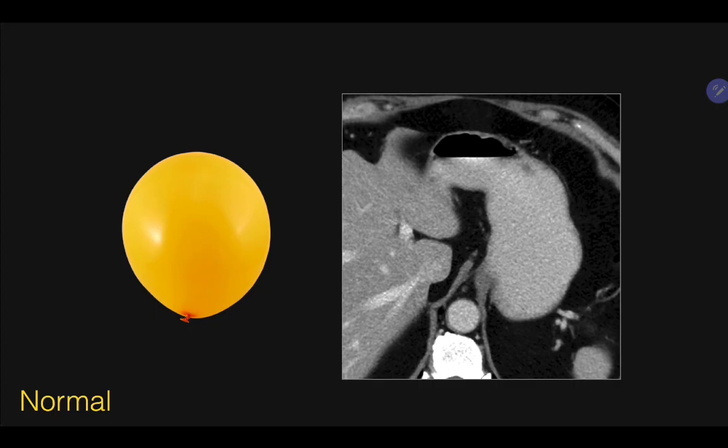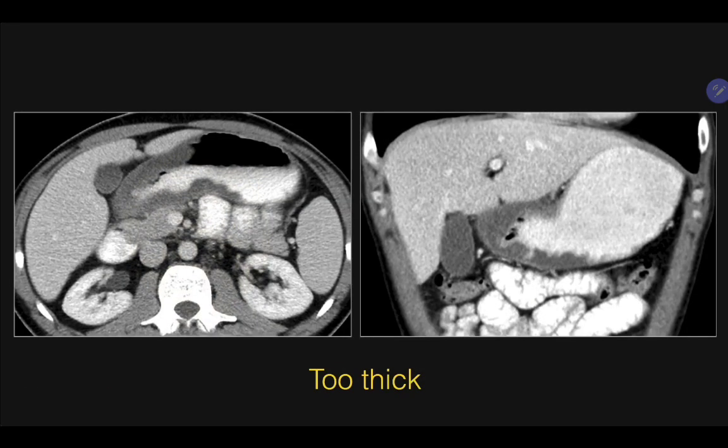Of course, the real diagnostic challenge comes in when the wall of the stomach becomes too thick. And generally speaking, we know too thick when we see it. So let's spend some time considering the causes of increased wall thickness.